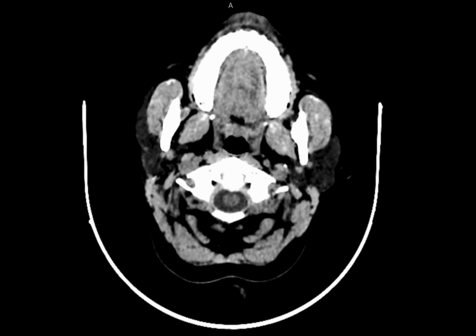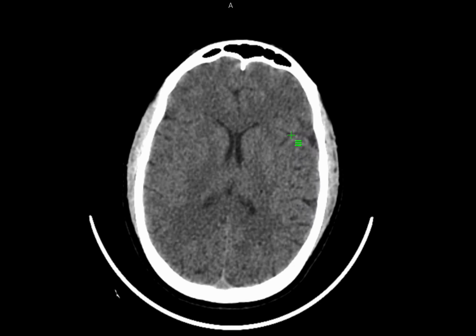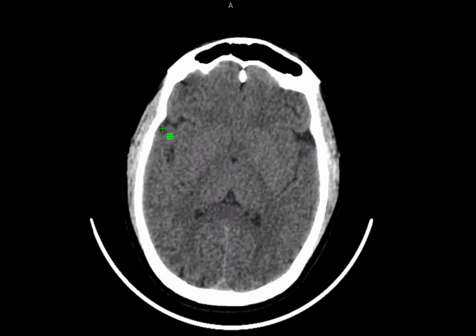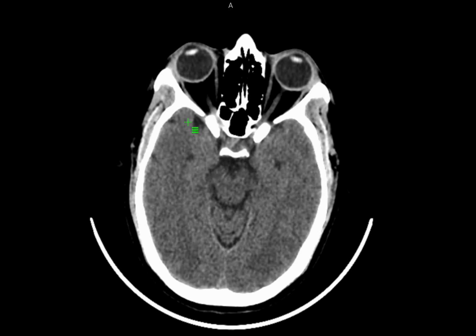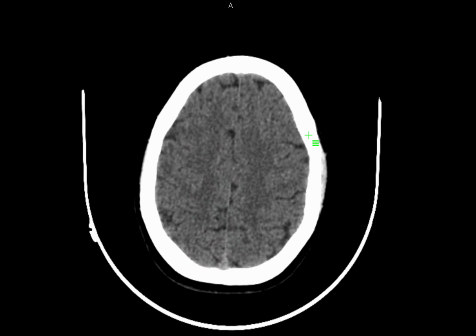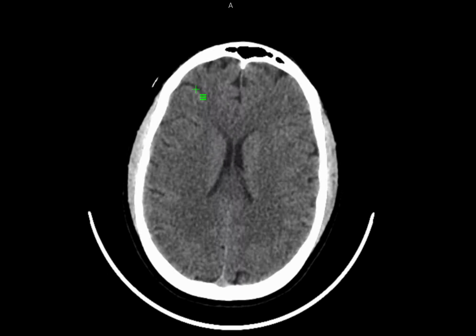And always look for hemorrhages. Hemorrhages in the brain can be of a few types. One is subarachnoid. Subarachnoid will be in the sulci or in the cisterns or in the fissures. Other than subarachnoid, you have a subdural hemorrhage. Subdural will be a concave shaped one like this. So that can be seen over the cerebral convexities.